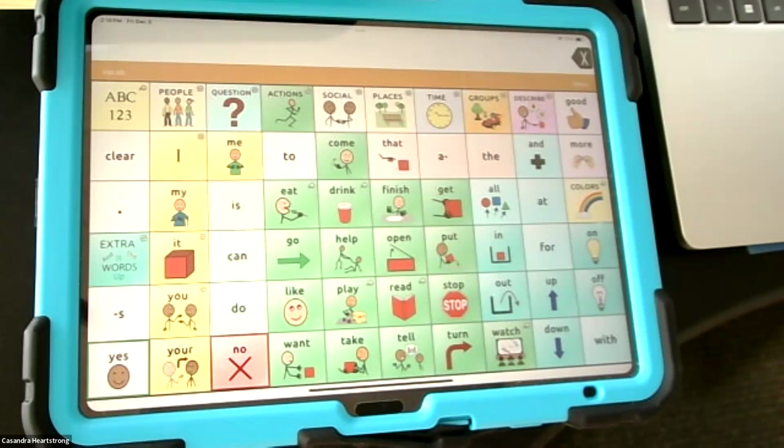When you are writing a simple sentence, where in the sentence, right, left, middle, is your pronoun or your subjective noun? It's at the beginning or on the left side. Where are our yellow pronoun words on the screen? On the left-hand side, helping us develop that place as far as language and literacy growth goes.